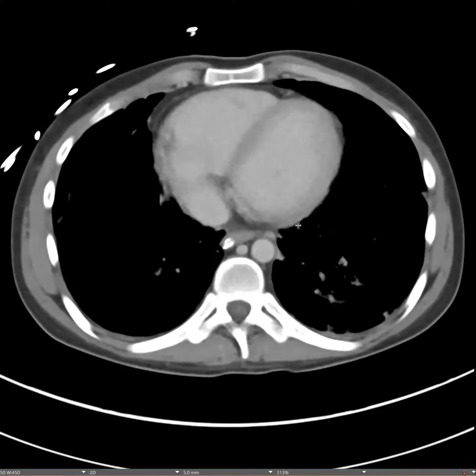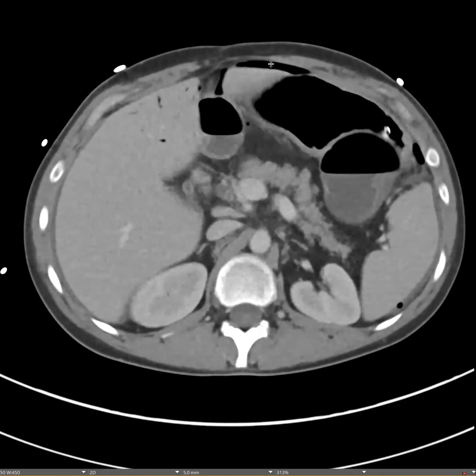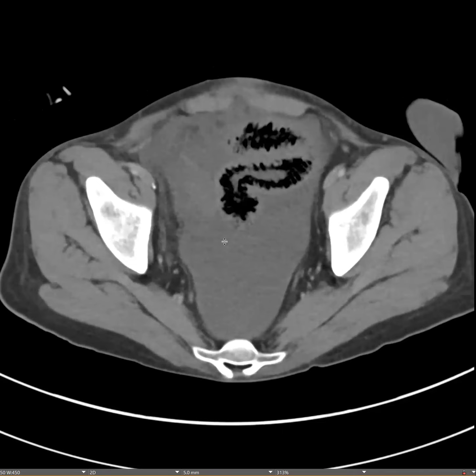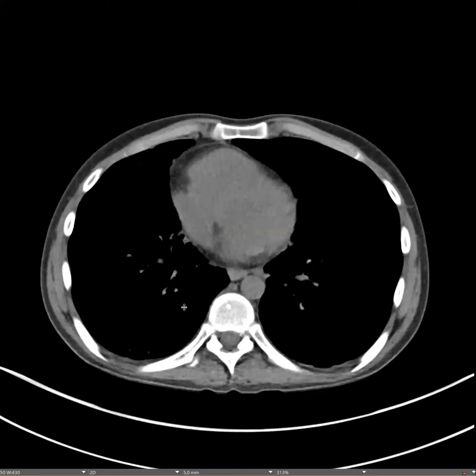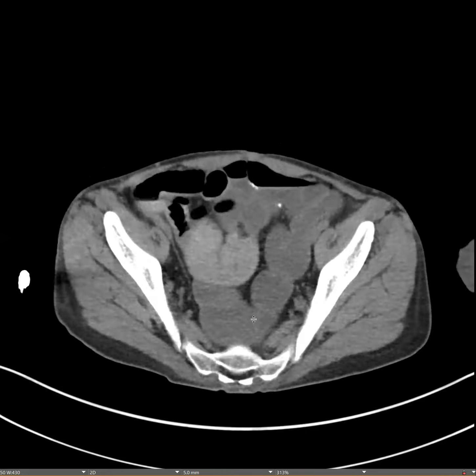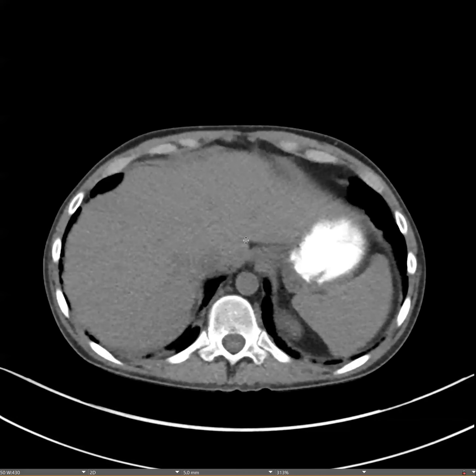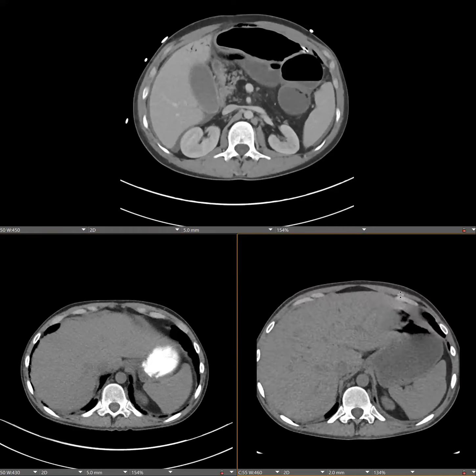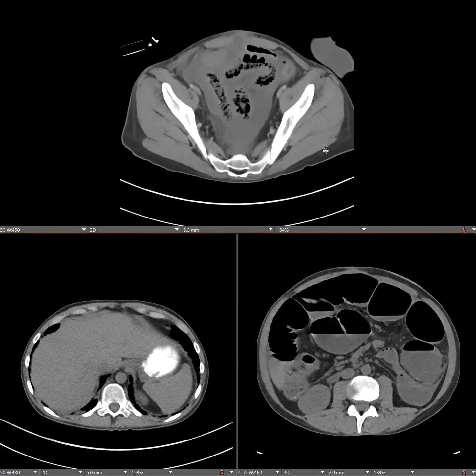worse? And this is from his June CT. And he has pneumoperitoneum, and a similar appearing bowel pattern, with free fluid and everything. And this is one after his December CT. And you can see all of them have resolved, except for some free fluid, and his pneumatosis and everything has improved. So this guy has been waxing and waning in his appearance. He gets this portal venous gas, mesenteric gas, pneumatosis and also pneumoperitoneum.